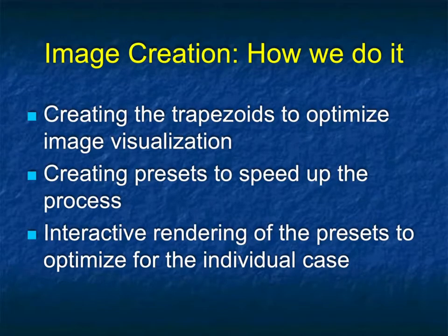At the end of the day, any 3D imaging, the truth is any imaging, really depends on the quality of images you create. One of the things about cinematic rendering, and one of the reasons people do not use it, they feel it's very difficult to create images. Our feeling is, yes, it's difficult when you get started, but there's a learning curve, and once you get past that curve, you can do very well.